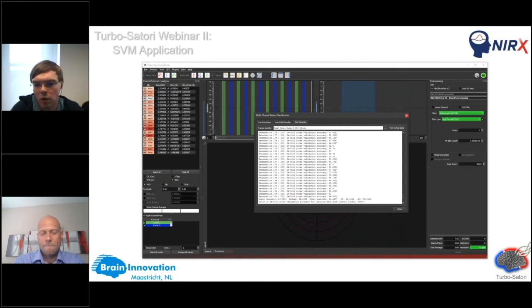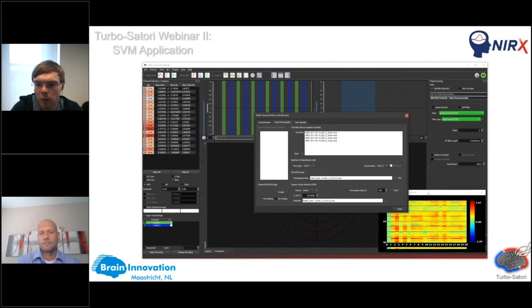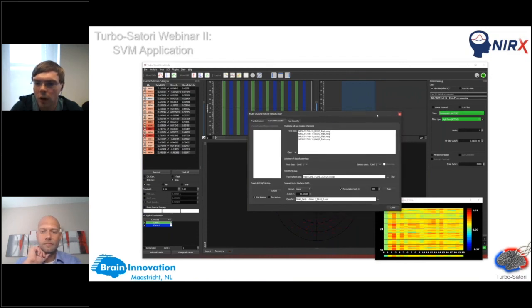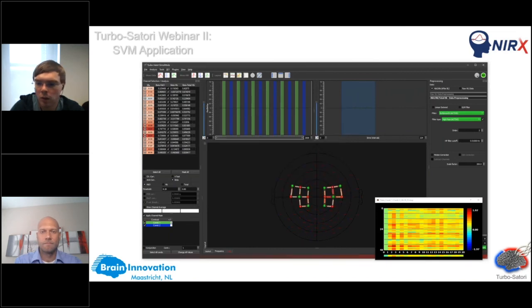So there's no optimization in that sense, but you can do some manual adjustments by just retraining with this specific C value. But if you look at your plot, you already would see some idea how good your data could be differentiated or how generalizable it is. And this is because you have the specific patterns, maybe in some more or less of the trials. So this gives you another idea, but just one way to look at it.